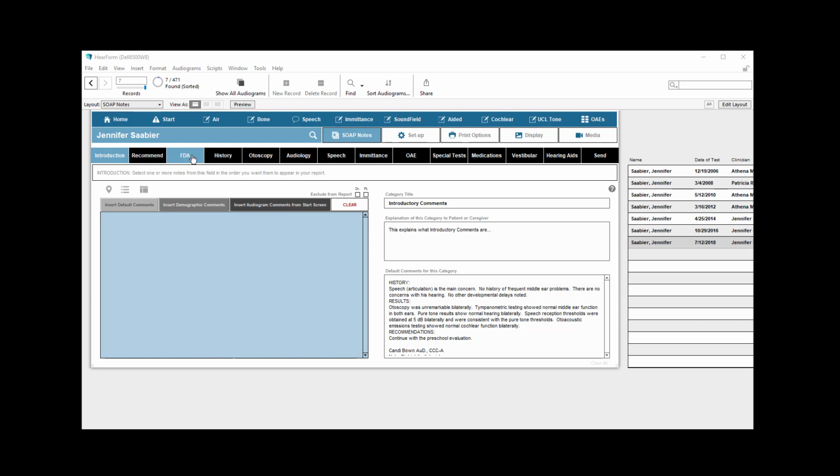And each one of these categories will allow you to quickly enter information in a number of ways. Again, we'll cover that in a subsequent video. So keep in mind that this is fully editable. All of these different titles can be changed. Let's just cover that right now.